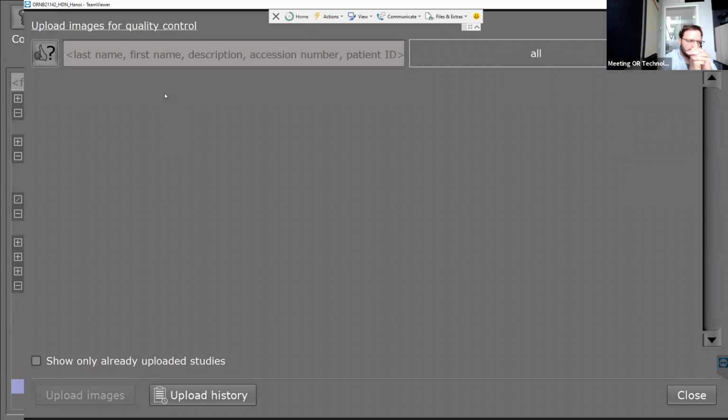Okay. Yeah. So this tool, upload images, is also like the support log tool. The support log tool just sends us the log files and the configuration of everything, so we can check it and give hints and maybe solutions. The other side is if you want to report to us, for example, faulty images, or you are not satisfied with the quality of the images.